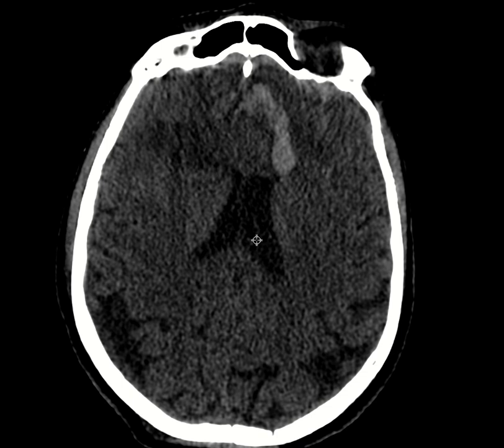So if you do your systematic approach, you're just going to get through all of these and you will be fine. So don't panic when you are sitting in the ER as a junior first or second year resident. Just try to be consistent with your search pattern, and always look for structures and pathology that you need to know and search for. Specifically in neuroradiology, we need to search for pathology to find it. It's not coming out to us. We need to specifically look for different types of pathology in neuroradiology.